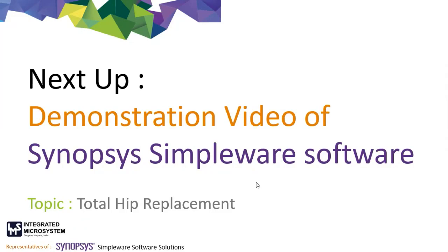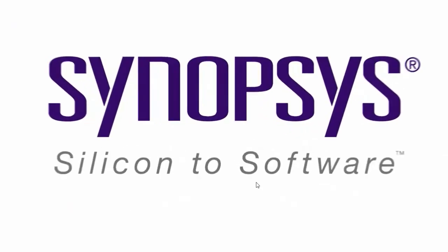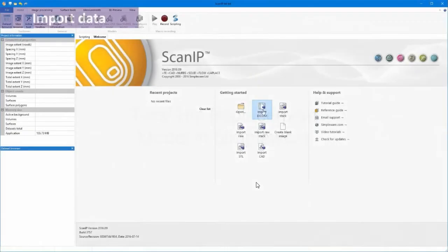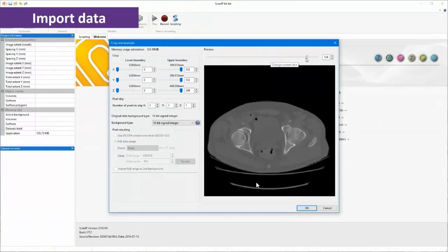So now I will show you a demonstration video of the software. Although this application may not be relevant to everyone, I assure you that all similar applications have the same kind of workflow throughout the image processing part. So this is a very common workflow. We started by importing our DICOM data.